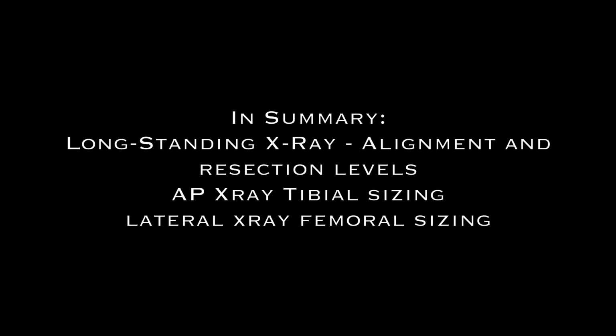So in summary, I utilize the long-standing x-ray to get my alignment and my resection levels, the AP x-ray for tibial sizing, and the lateral x-ray for femoral sizing.